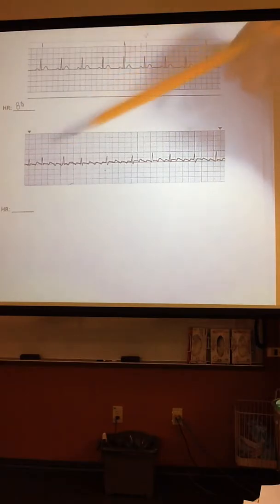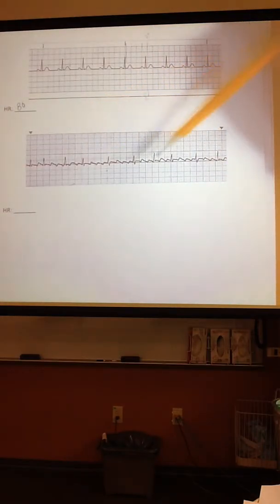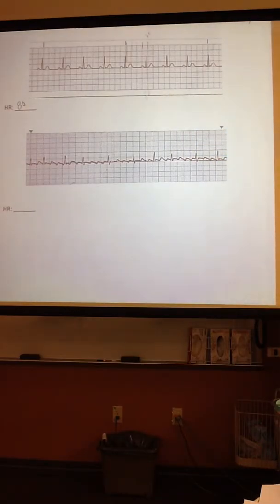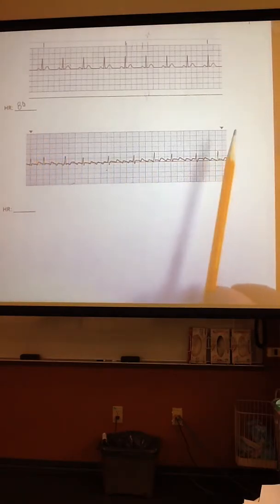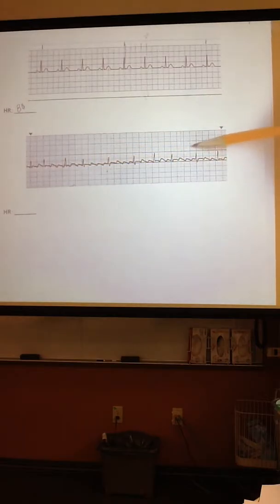This looks like atrial flutter, which you'll learn about. It's a sawtooth pattern. Sometimes the markings on EKGs are a little odd. This has a marking every 3 seconds, and this has a marking every 6 seconds. If you're not sure, you can always count your blocks and make sure you have 15 large blocks.